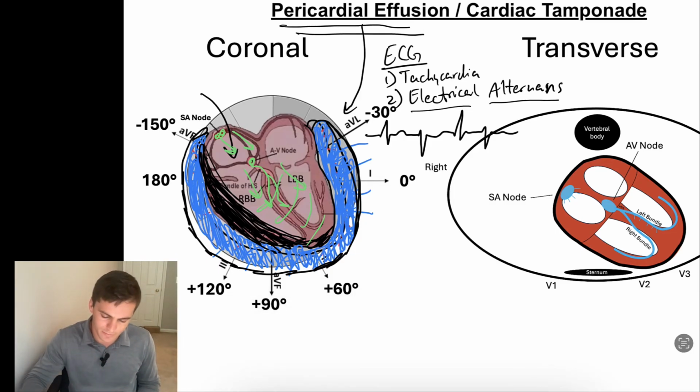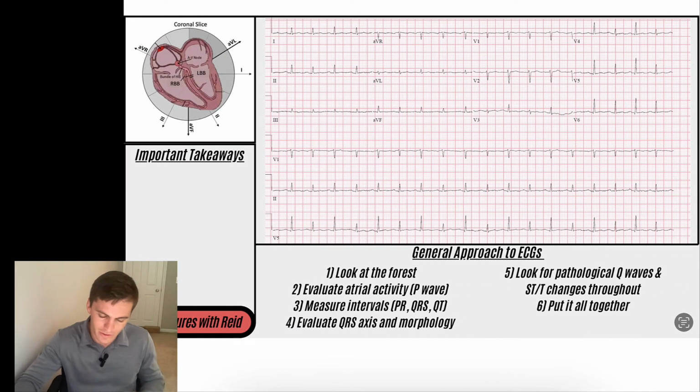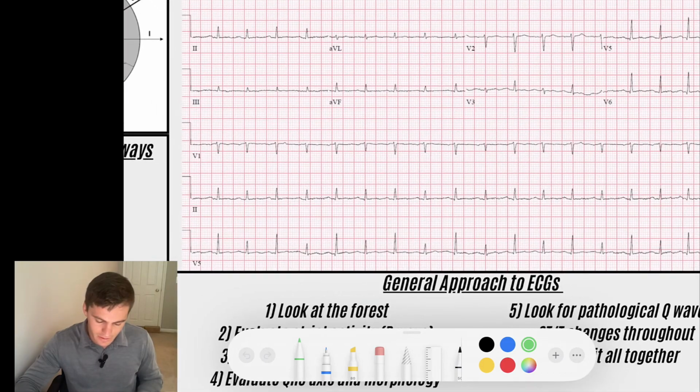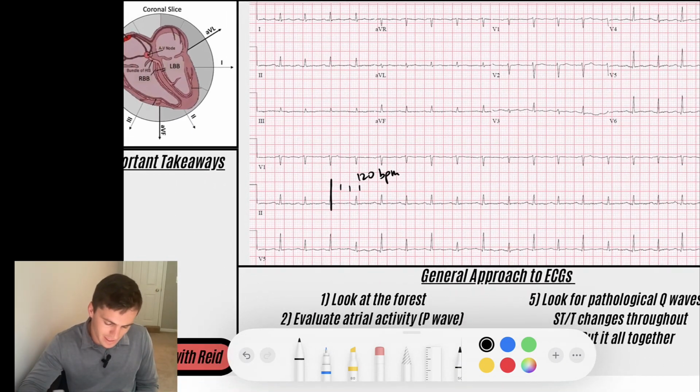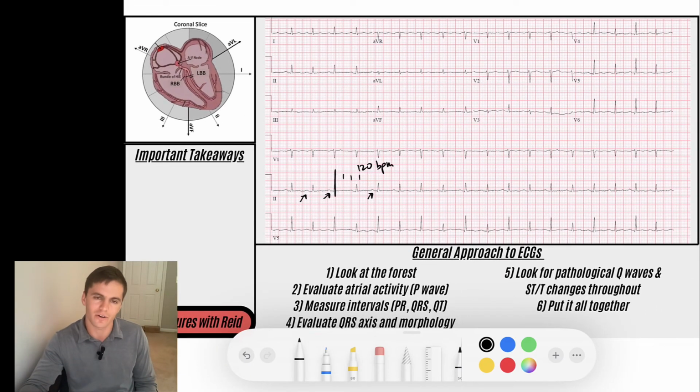And I have one example. And so here it is. You've got this person in a tachycardia. You can see the rate here. If I find this QRS on the solid line, 300, 150, 100, so it's between 100 and 150, maybe 120 beats per minute, right? So they're in tachycardia. It's a sinus tachycardia. We'll just briefly, you can see P waves in front of the QRS complexes, right? So this is a sinus tachycardia.